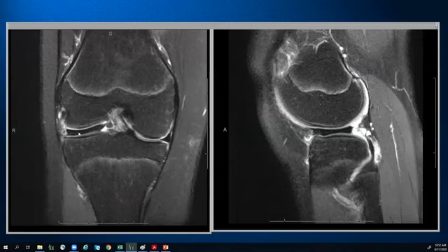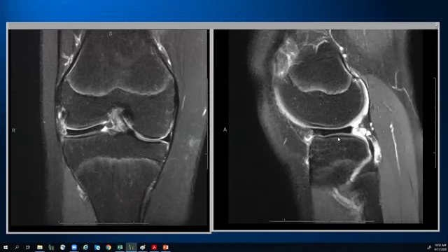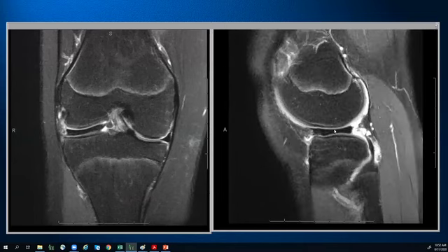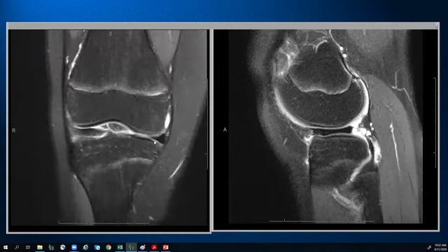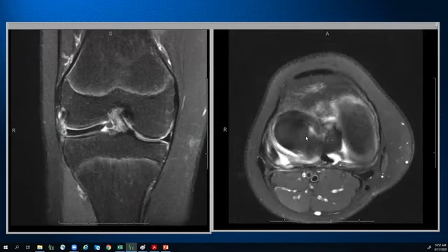It's this humongous rectangle. And then on the sagittal images, you'll notice that when I'm in the body of the lateral meniscus, I could see this for 1 slice, 2 slices, 3 slices, 4 slices, 5 slices, 6 slices. They never separate into the typical bow tie configuration that you're used to seeing. So when you see this abnormality persisting involving the body for more than 2 or 3 slices, that's telling you that you're looking at basically a discoid variant of the meniscus, where it's no longer that nice C shape, but more of an O shape. Let's see if we could catch it nicely in this. Oh, we can't. So it's very hard for me to show you exactly what's going on in this axial plane.